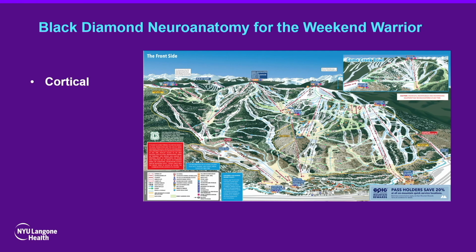I'm going to talk to you about three different areas. We're going to talk about cortical anatomy, sulcal anatomy that's useful. I'll show you some functional MRI, but again, the expectation is not that you will learn fMRI, but at least learn some of the locations that are really important to the referring physicians. And then we'll talk about what I think are the key white matter pathways that you should be able to guess where they're going to be, even when you're reading just a CT or an MR.